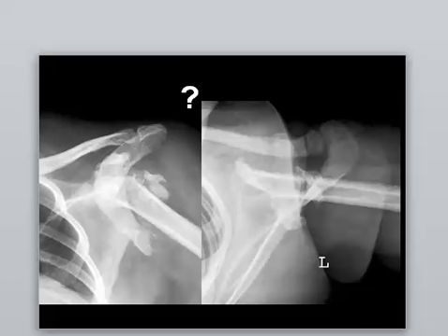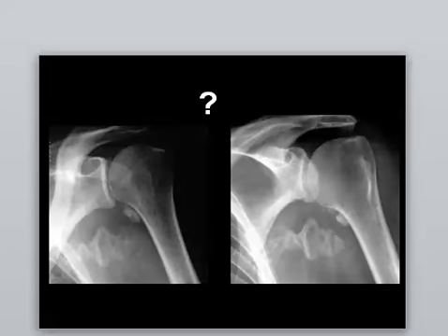Of course, trauma and osteoarthritis could result sometimes in such an appearance, in advanced lesions. Here there is muscular calcification. This is called myositis ossificans. See about this part also. This is myositis ossificans.